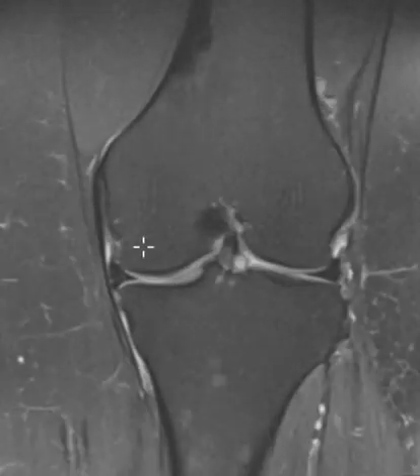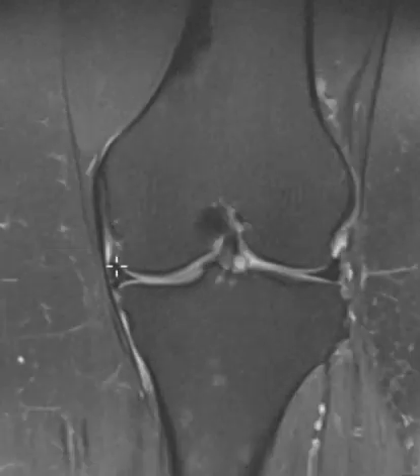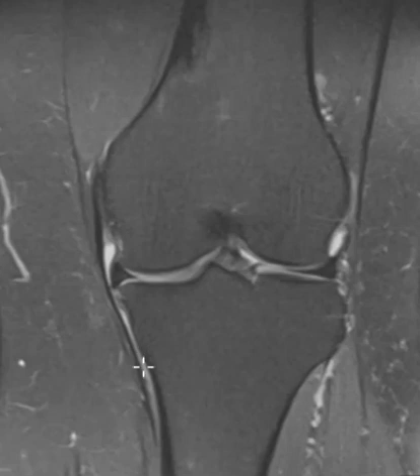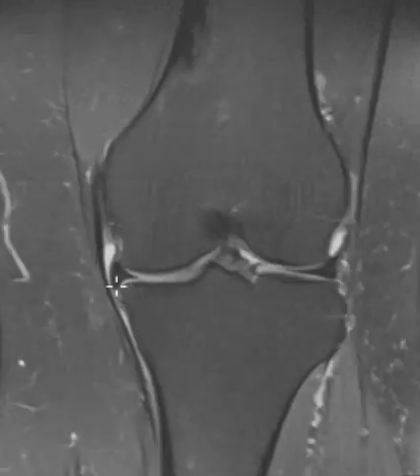And the MCL has two components. It has an outer thick component here. It has a thinner inner component. And the thinner inner component is adherent to the medial meniscus here. So the inner thinner component here, the capsular fibers, are intact. And the outer fibers here, the thick outer fibers, are intact. So this is a little fluid collection insinuating between these outer and inner fibers.